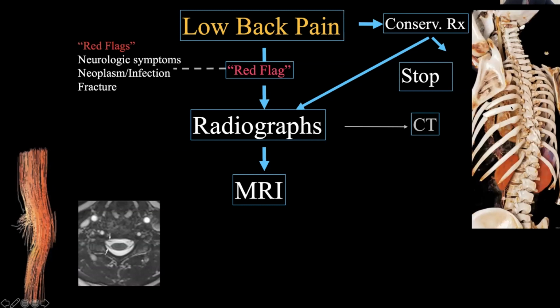Just in case you're wondering what these images are, in fact, I'll ask a quick question. What do you think this image is that I just showed you? This picture of a spine with a bunch of rib fractures. How do you think we got that picture? Anyone? 3D reconstruction from probably CT or maybe an MRI. Correct. 3D reconstruction from a CT.